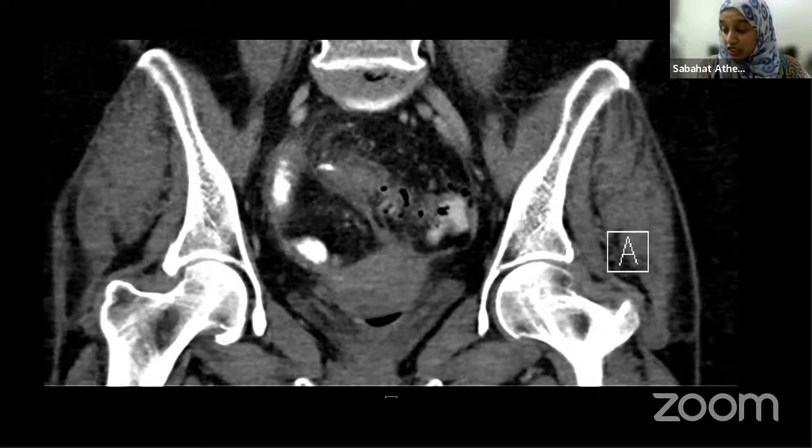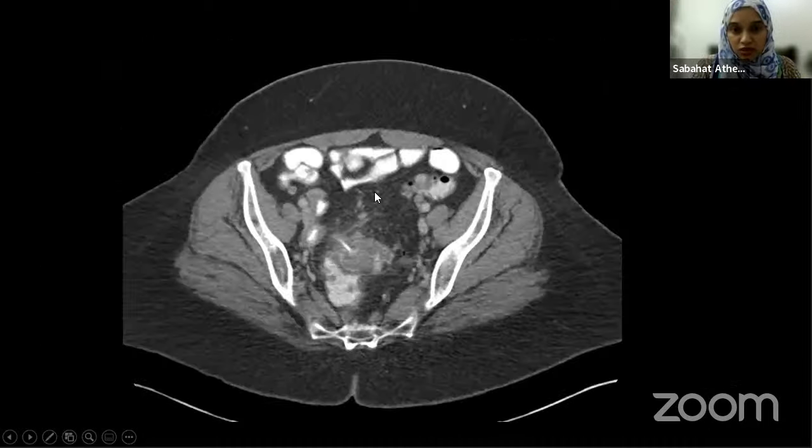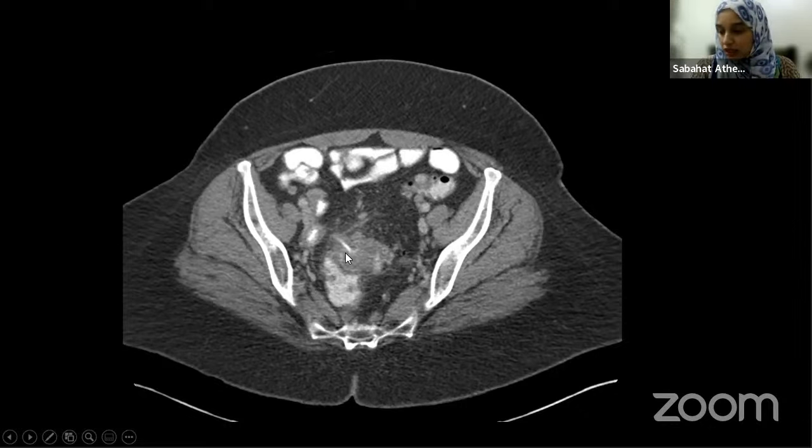Blush. I totally understand where he's saying suture. Excellent. Okay, so what you're calling suture and what you're calling active extravasation, because this structure seems very, very similar to the contrast. So it's a bit tricky. But when you change the density, can you see this linear object here?